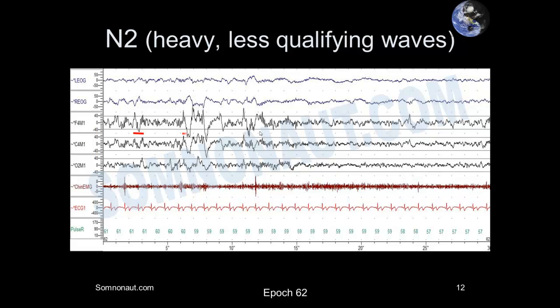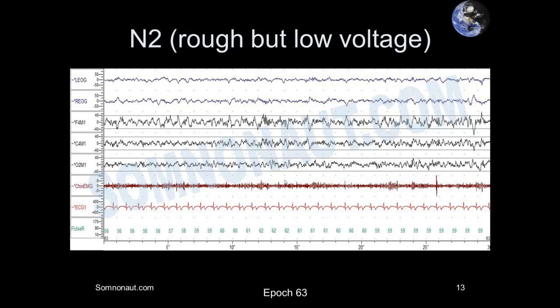So that's interesting in that it still stays at N2, especially since there's a little bit of arousing going on over here. In this epoch, again, might be slow enough, but this is the kid who doesn't meet the bar at the amusement park. It's not tall enough. Definitely within the band of the ruler.